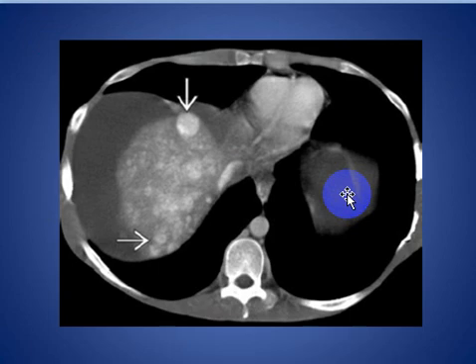As we see here, nodular regenerative hyperplasia in a young man with Budd-Chiari syndrome, venous phase, we see multiple enhancing hypervascular nodules and a large amount of ascites. Some of the nodules are encapsulated and others have a central scar. In this clinical setting, the findings are characteristic of a macroscopic form of nodular regenerative hyperplasia.